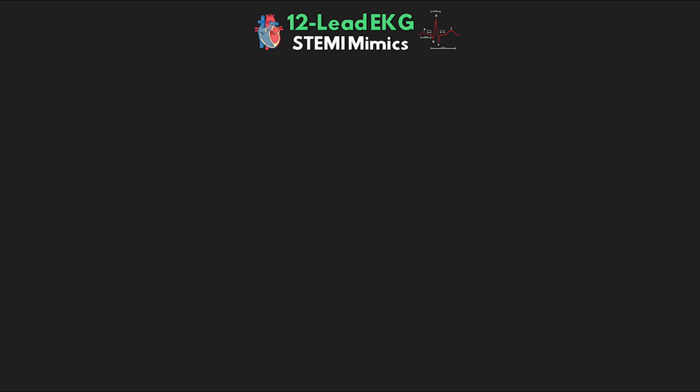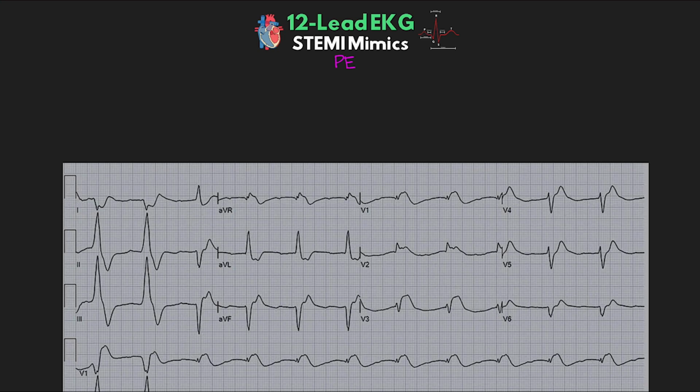Alright, next we're going to talk about our pulmonary embolism, or PEs. And particularly massive PEs can lead to ST elevation changes on our 12-lead EKG. So let me go ahead and put up an example on screen while we talk about this one. So in this example here, we actually see ST elevation in V1, V2, V3, and V4, as well as aVR and aVF. Now this would actually be an odd pattern when we think about our contiguous leads.